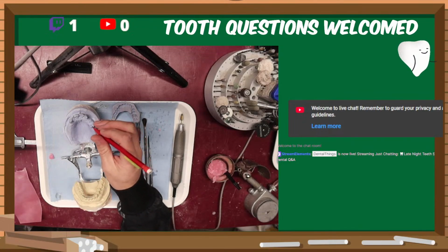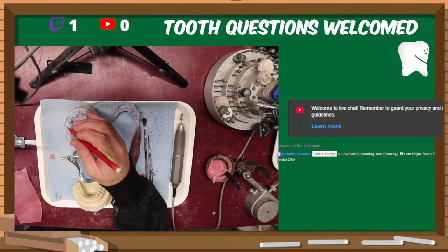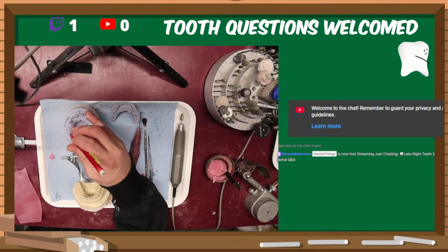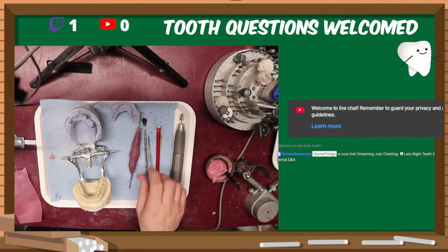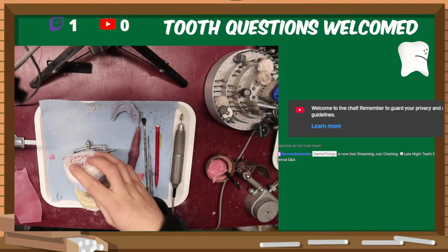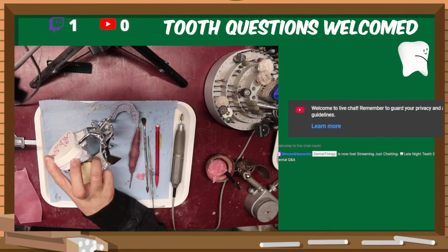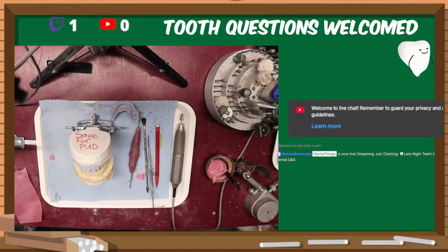And then we got our first molar, and then our second there. Canine, we'll go first, second, first, and second. Ooh, how much room do I have? Not that much. That's probably going to be an issue.